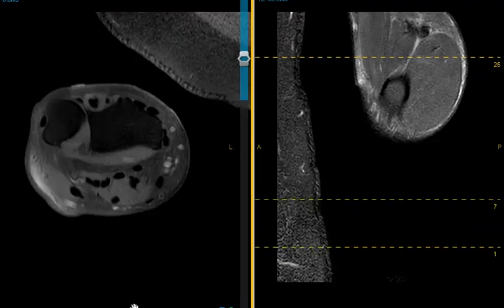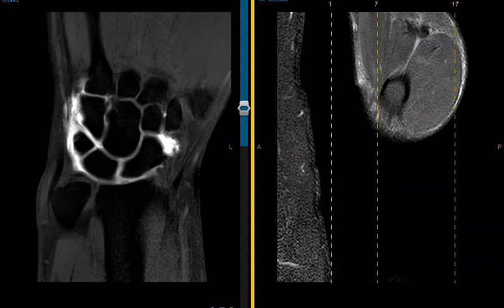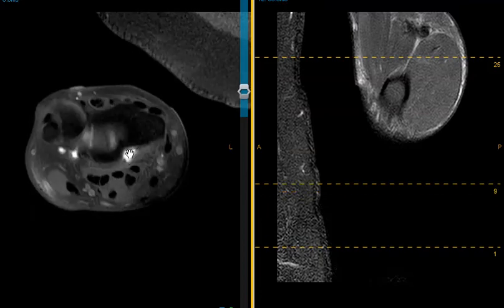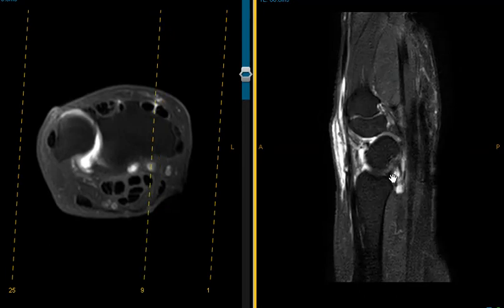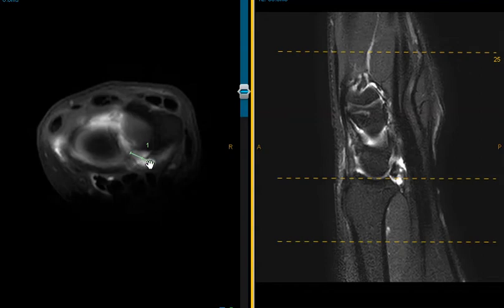Here there is another example where the patient had contrast in the joint. So if there's prolapse of fluid, it'll show up a lot better. And there it is, same little contrast collection over the palmar distal radius, a little weakness in the joint capsule, a little fluid poking out here, and look, it goes out and down. Here's another patient, a little fluid right there, and here's the fluid on the palmar aspect right there that goes out and down a little bit. Here's the next patient. We do see the same little thing, the radius, little tiny collection of fluid there protruding through a small defect. And here it is on the sagittal view, little fluid collection.